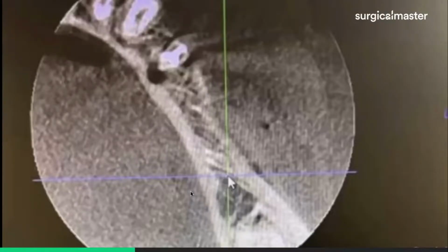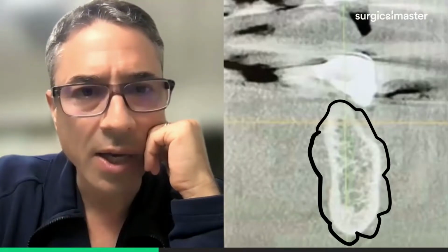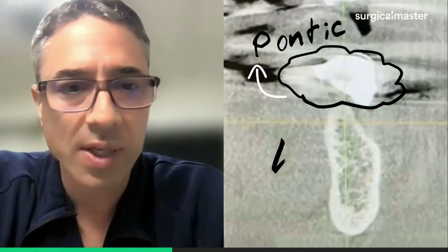Here is the CT scan, and it's a great CT scan, and it shows a great section. Rashad, you can mark the nerve there. You can see a circle, you can see the outline of the ridge, and there's a nerve position, it looks like. And here we see probably the pontic site with a missing buccal contour. Okay, so it would be great to see the soft tissue.